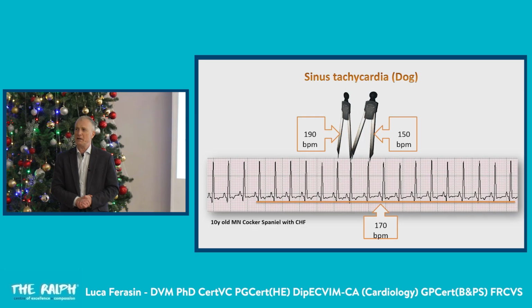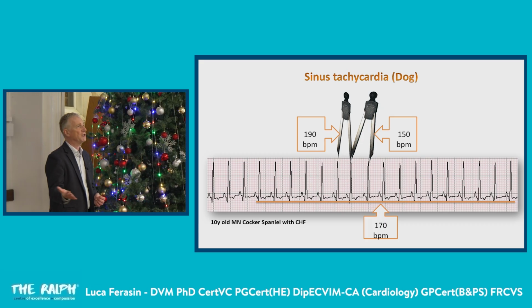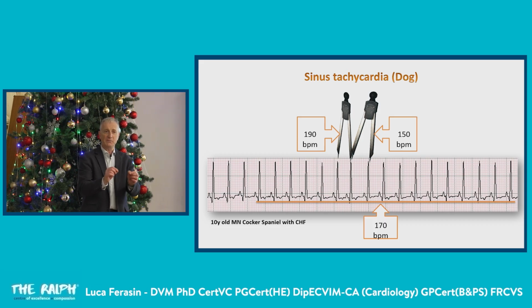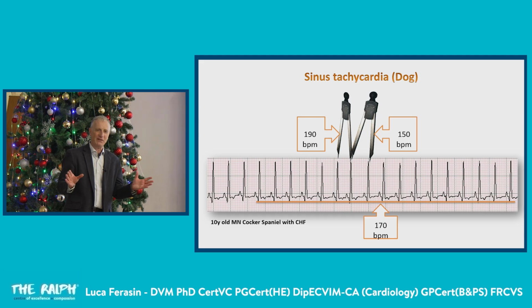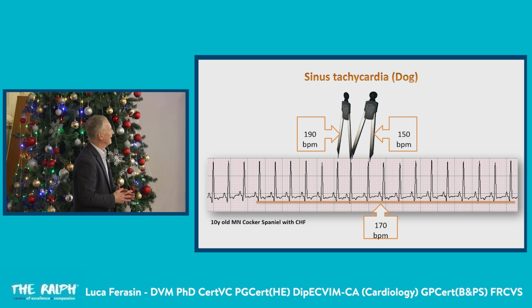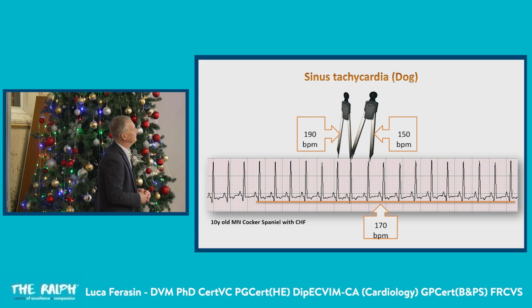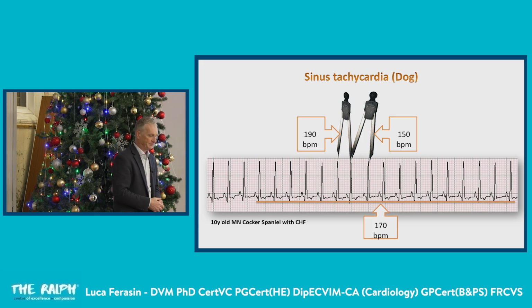But if you want to be very pedantic, especially because you all have digital ECG machines, 100% of you can actually use the digital calipers to measure the RR interval. And there are slight changes. Although it looks subjectively very regular, there is a little bit of variation from beat to beat, even with a heart rate of 180, 170 average here. And something you don't see with supraventricular tachycardia. That tends to be metronomically regular.